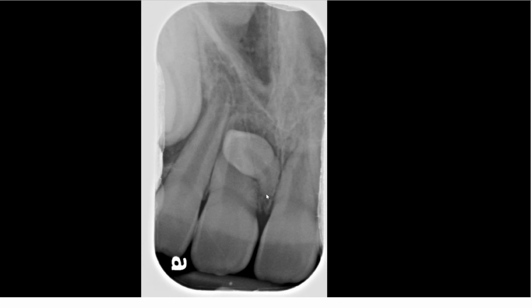Again, did we see that on panoramic radiograph? Absolutely not. As a matter of fact, mostly what we saw is this relatively round opacity over the roots of number 8, and that was about it. It was hard to determine that there was a dilacerated root portion running down between the two roots, right?